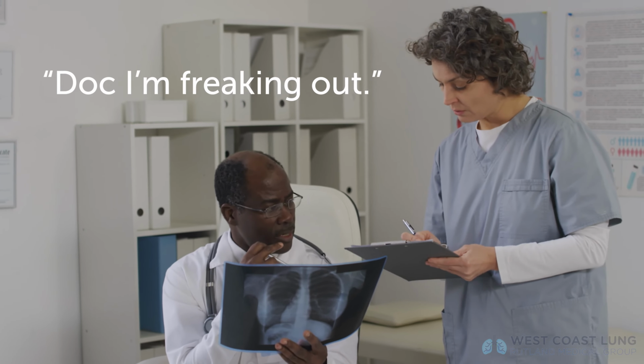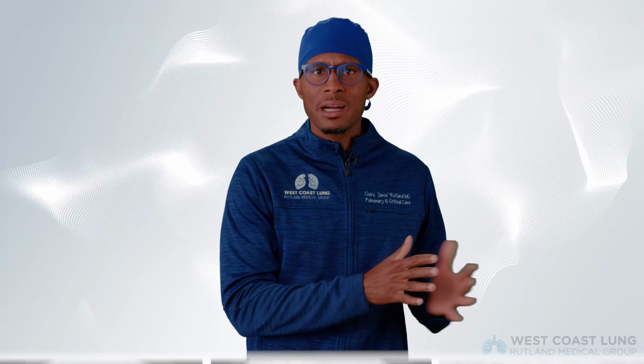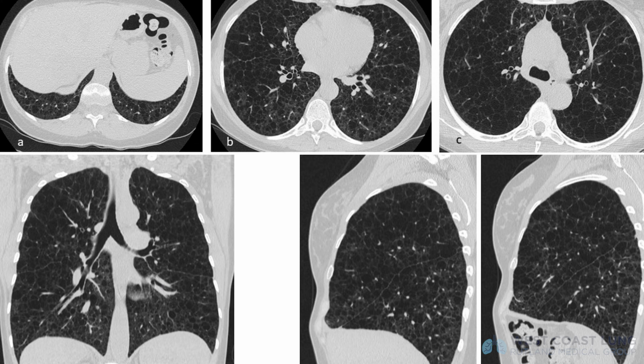Cystic lung disease is something I see all the time. Most might freak out a little bit when they see cystic lung disease on a chest CT, but just understand the differential diagnosis. This will help you. Diffuse cystic lung diseases are a group of lung disorders characterized by the presence of multiple regular or irregular spherical parenchymal lucencies bordered by a thin wall and having a well-defined interface with the normal lung, like this. You can see the cysts on this CT.